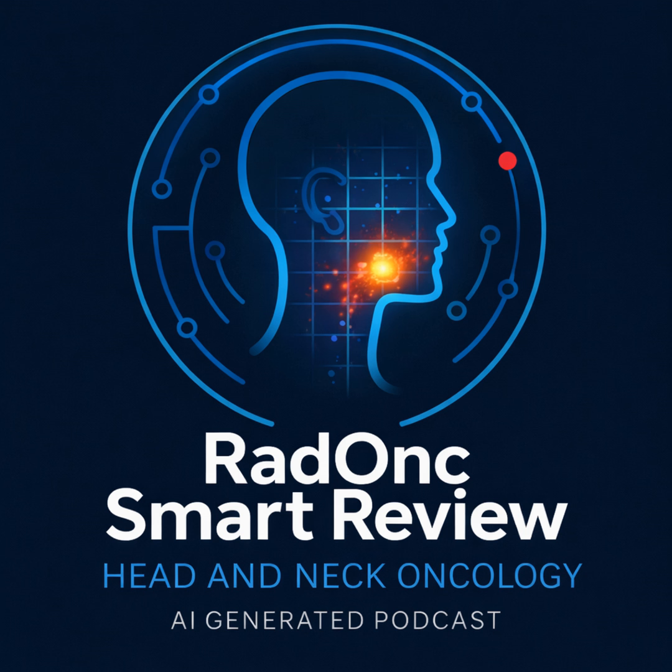But let's not get ahead of ourselves. We need to see the imaging. We have the full trifecta: CT neck with contrast, PET CT, and an MRI. Let's start with the CT neck. It shows a 3-centimeter mass in that left piriform sinus. It's clearly replacing the air-filled space and demonstrates involvement of the paraglottic space. Now, for the neck, there is a necrotic 3.2-centimeter node in left level 2 and a 1.8-centimeter node in left level 3. Necrosis in a level 2 node.